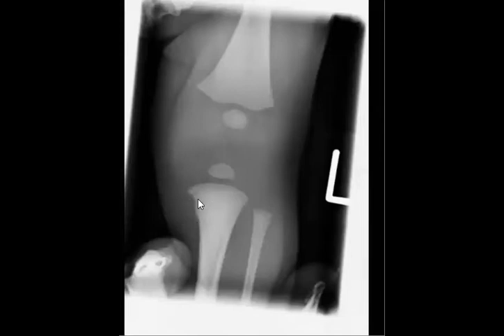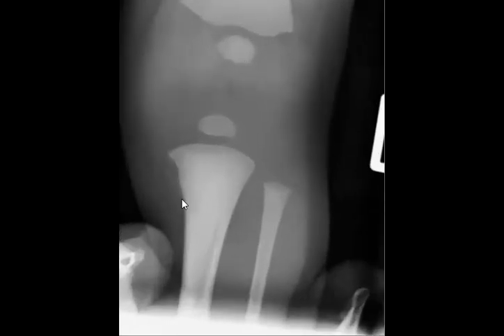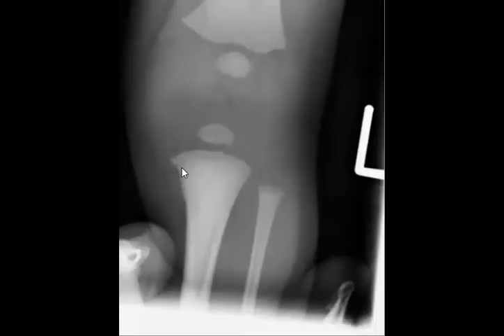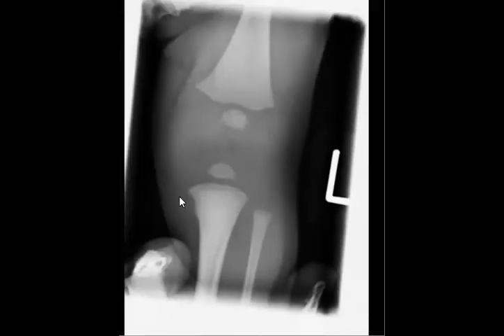Which one would you like? Just zoom in, we can see. Maybe the buckling here. What do you think? Yes, this one, both buckling. Maybe both. I agree with you. At least you detected the fracture, so thank you.